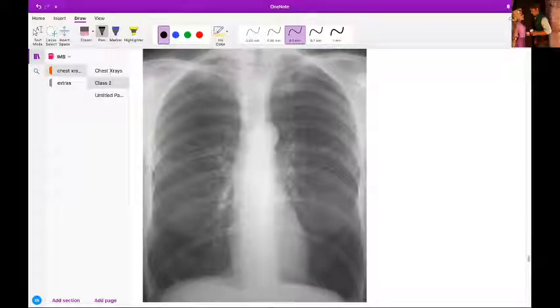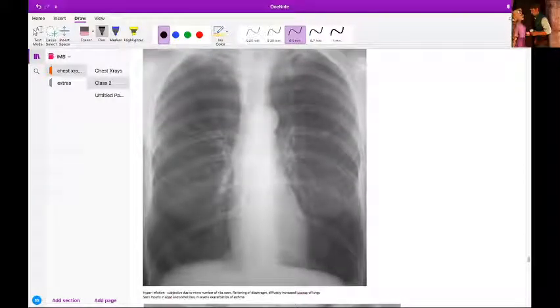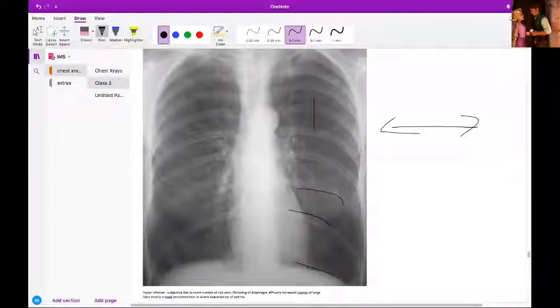So why do you guys say COPD emphysema? Why do you say it? Yes, because there's hyperinflation. So what makes you think that there is hyperinflation? Basically, signs of hyperinflation are hyperlucency of the lung tissue, flattening of the diaphragm, the ribs will be more widely spaced, so the intercostal space will be increased. And if you see the lateral view, the AP diameter is increased. So these are the signs of a hyperinflated chest. It's most commonly caused by COPD, severe exacerbation of asthma, and emphysema.